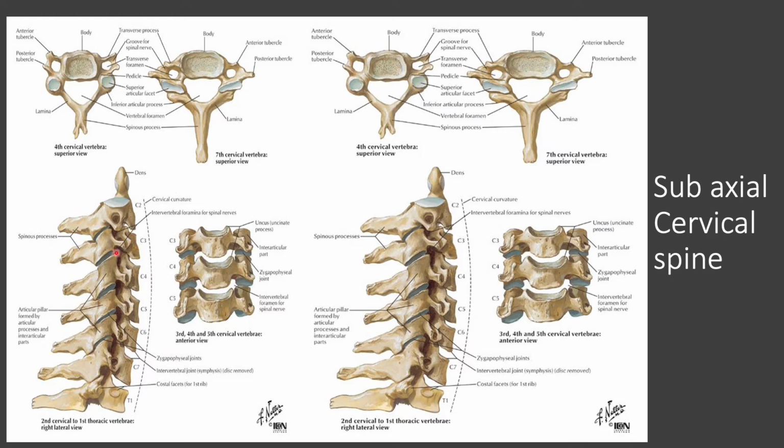And here's how it actually looks in a sagittal or side view after articulation. And you can see your lateral mass here with the superior and the inferior facets and the neural foramen. And this is the anteroposterior view where you can actually appreciate your uncus as well as the uncovertebral joints between C3 and C4 here. So you can see that all these are well aligned.